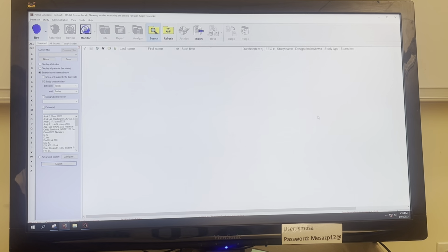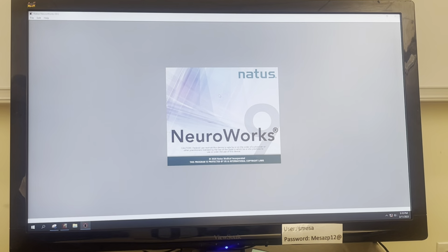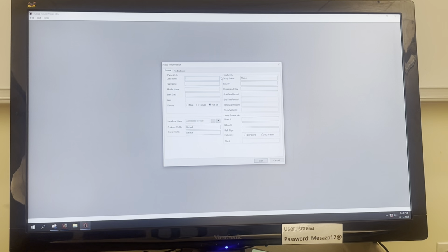Okay, I'm going to show you how to create, copy, and edit a file in Natus. Okay, so you have to be recording, or at least we'll have started a new file. I'm just going to start a file here.